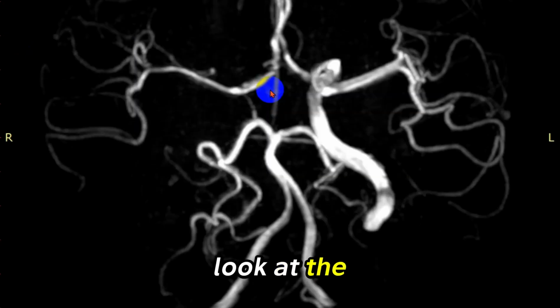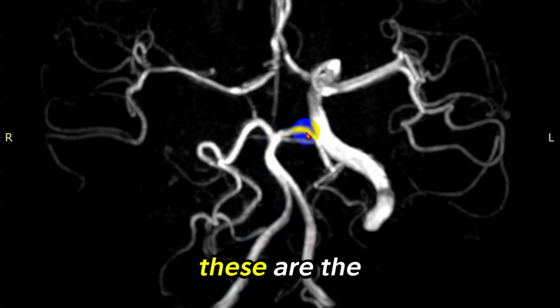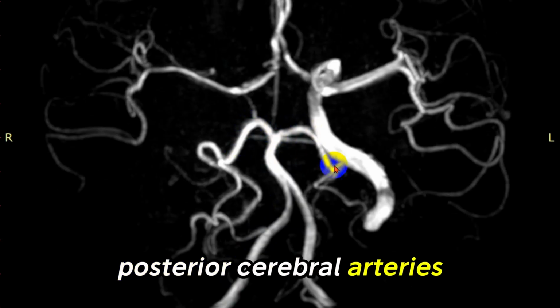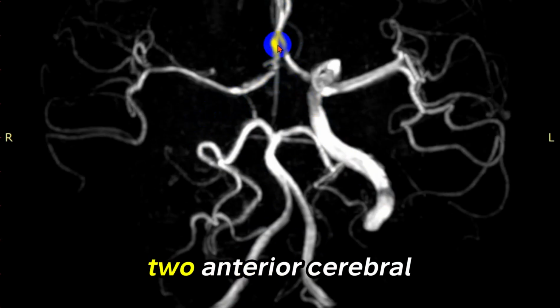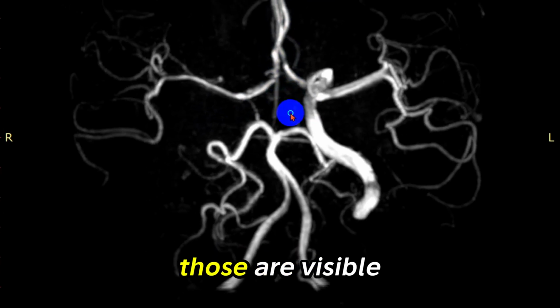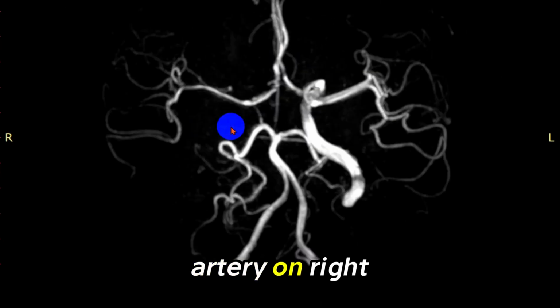If we look at the circle of Willis, here we can see these two are the right and left vertebral arteries. Here it's visible, these are the posterior cerebral arteries. Here is the internal carotid artery of left side, but in the right side there is no internal carotid artery. Here we can see these are the two anterior cerebral arteries, those are visible here, but there is no internal carotid artery on the right side.